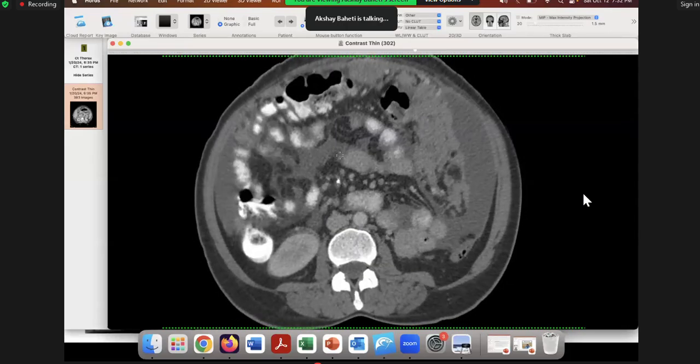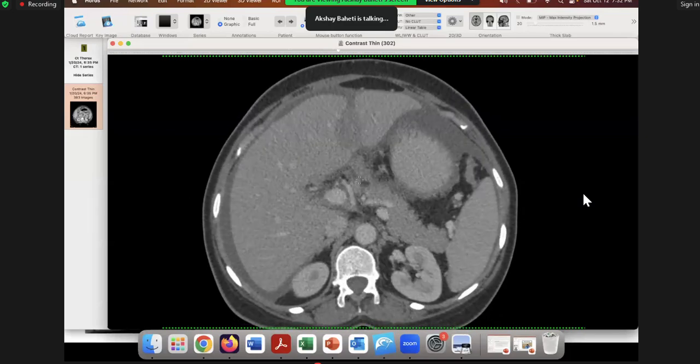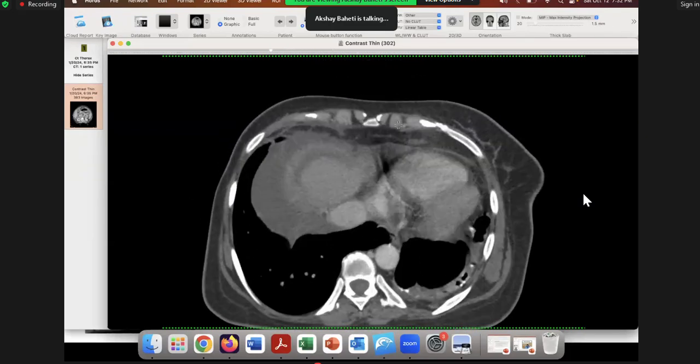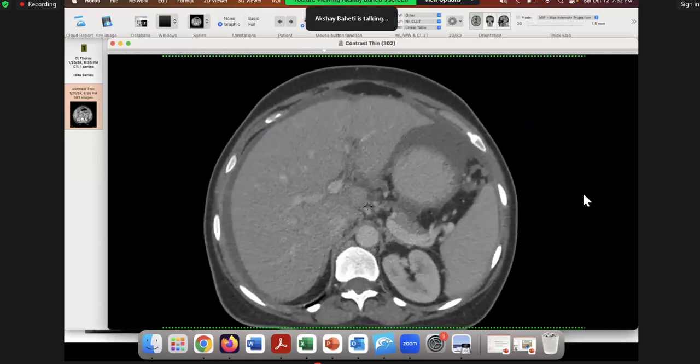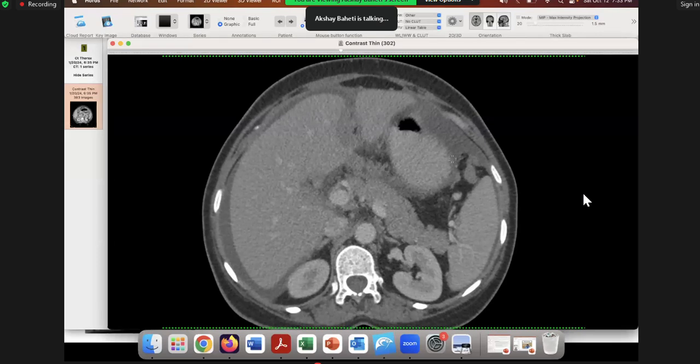All right. So at baseline, which is the first time that the patient comes, they're going to ask you what is involved, assuming that there's no intrathoracic involvement. You don't see internal mammary nodes. It's just a peritoneal disease and maybe some retroperitoneal nodes. Then they will consider whether to operate upfront or give neoadjuvant chemotherapy and then operate. All right. If you show them difficult sites of resection, they will prefer giving neoadjuvant chemotherapy, shrinking the disease, and then operating. If overall they think that, okay, there are no very difficult or complex sites, then generally most surgeons, if the slots are available, will operate upfront because it's easier to operate upfront.